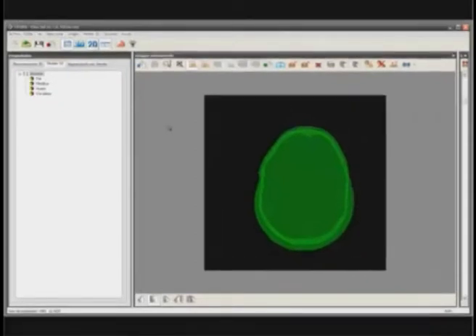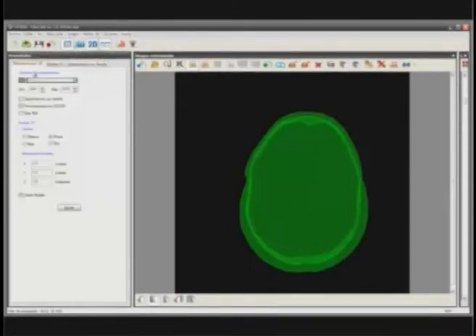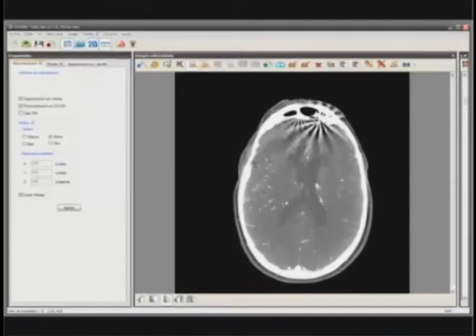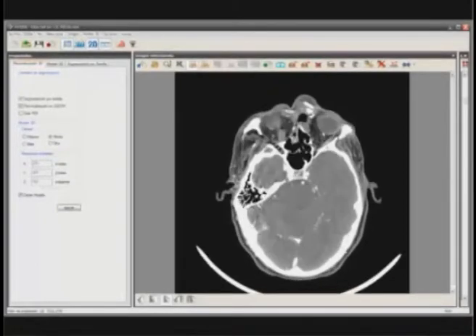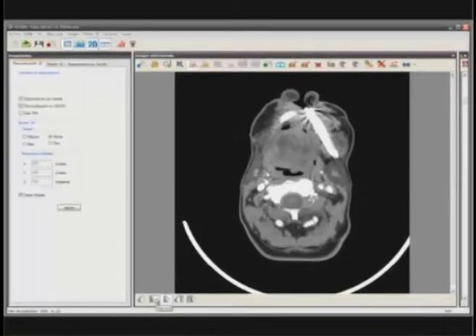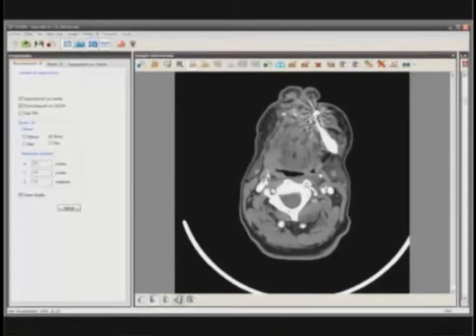There are several displays installed in AYRA, including one that allows us to watch the cinematographic sequence of the cross-sectional cuts, as it can be seen in this CAT scan showing a large tissue distortion that belongs to a patient who suffered a gunshot wound to the mid-face. We can scroll it up and down and visualize the multiple cuts of the CAT scan.